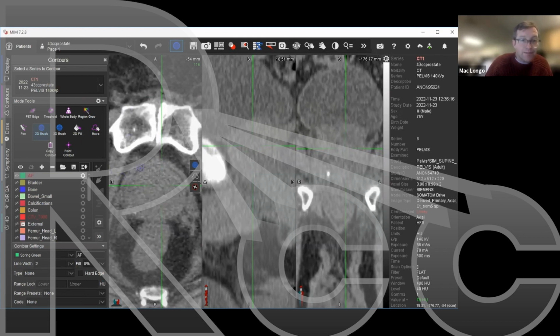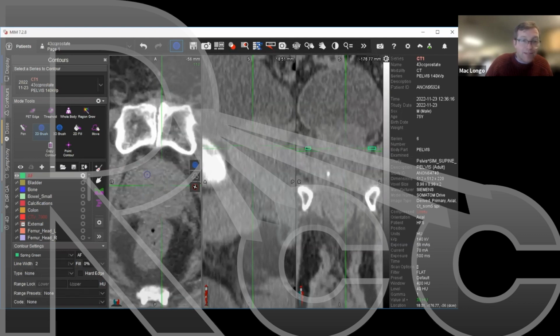It moves anteriorly and laterally. And this is fascia. It also houses the dorsal veins, which are vascular structures that we really want to spare because they help contribute to erectile function. So that's not prostate. That's the anterior fascia.